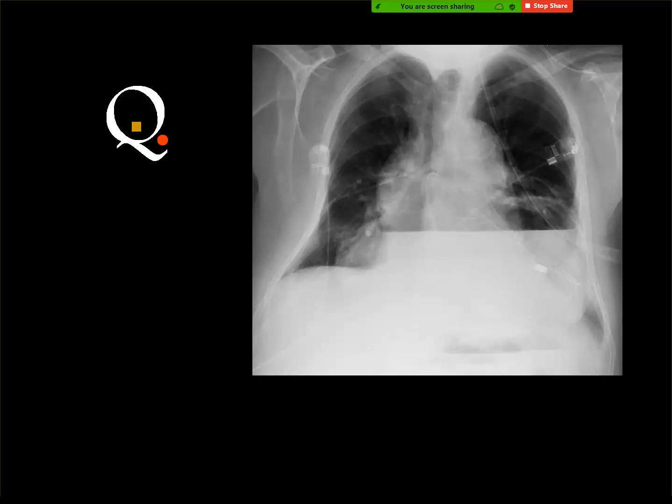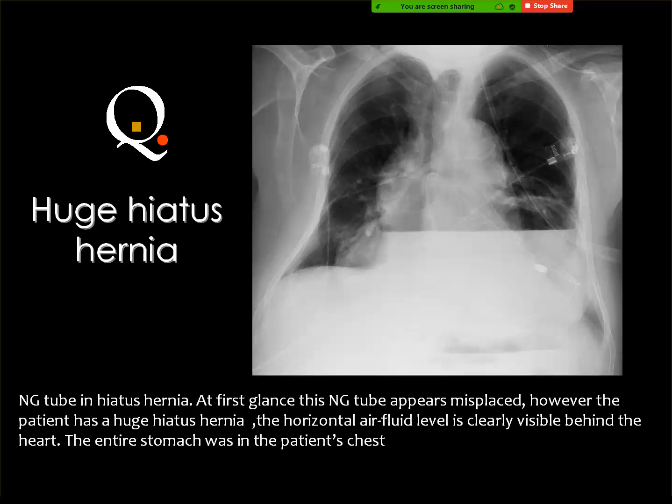Pneumothorax. Which side? The left is clear. The left costophrenic angle is clear. Hydropericardium. Pneumopericardium. Hydropneumopericardium, but this is the right cardiac border which is free. Hiatal hernia. Hiatus hernia. Yes, this is a massive hiatus hernia, and it contains an air fluid level, of course, because the stomach is totally herniated in the hernia, and the gastric contents will form this fluid level.